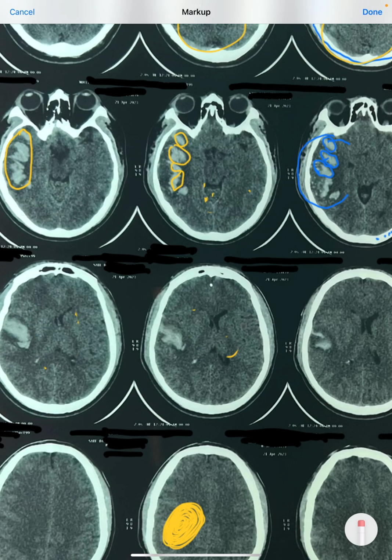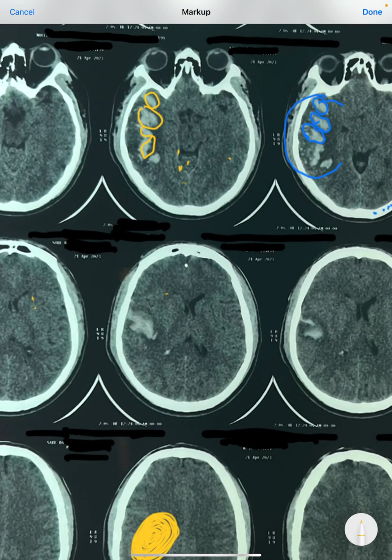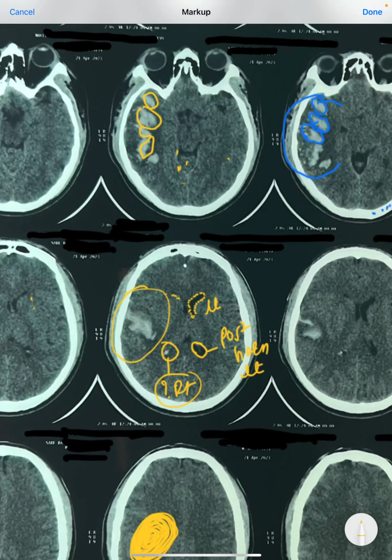Now we see here, these are the two lateral ventricles. This is the lateral ventricle of the left side, which is very well seen. This is the posterior horn of the lateral ventricle. This is the posterior horn of the lateral ventricle of the left side. But where is it on the right side? On the right side it is not there because it is all compressed because of this edema. Here also it is almost very compressed. We are not able to see.